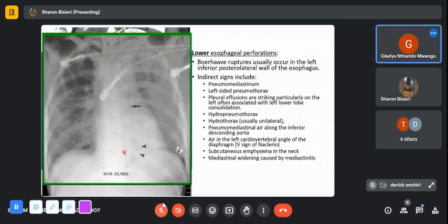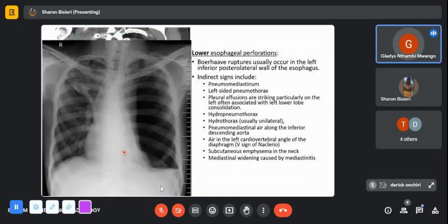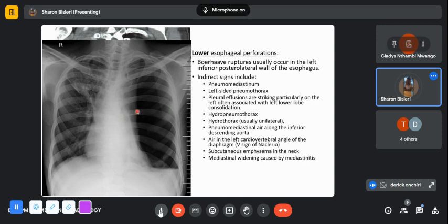Because despite the slight atelectasis of the right upper lobe, it still doesn't explain why we have more of the heart on the right side. And the other thing one would look at would be the relative difference in the lung field. But here, of course, because of the pneumothorax, you can't rely on that to see how significant this shift is. Do you have an answer? No, I was just thinking.